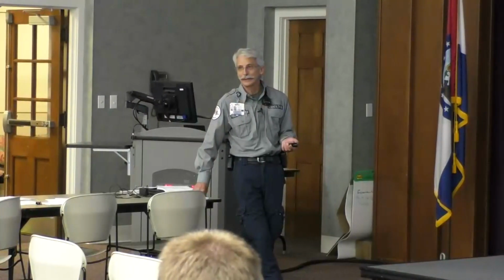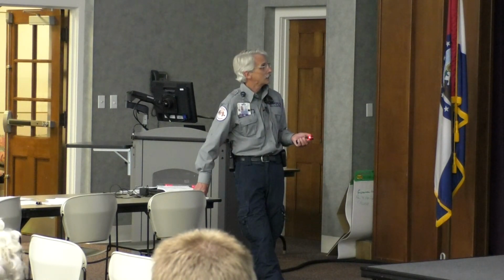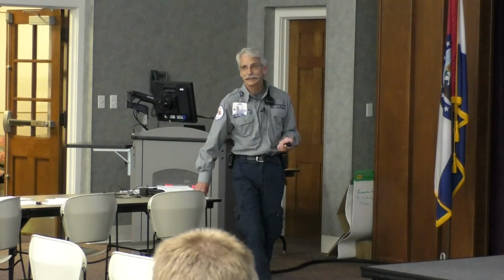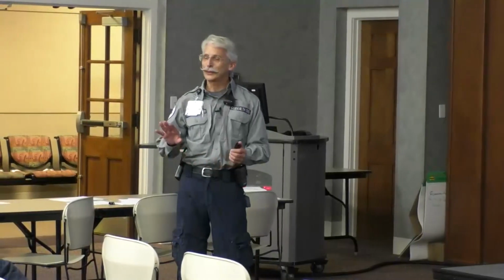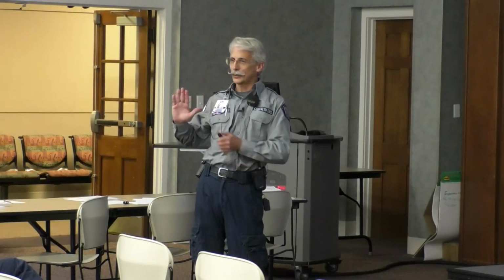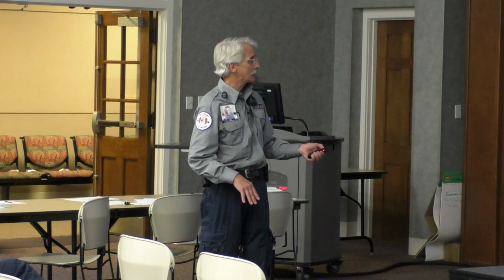So it depends which ones you look at a little bit. So could I count from here to here? No. Yes, I can. Because that's all one continuous time across there. I thought it had to be the same lead. No, when you're looking at a 12 lead, this is one big long lead there. That's why whenever it has the fourth one going across the bottom, you'll see that it coordinates with every one of those. Just looking at the time across there, I can look at that.